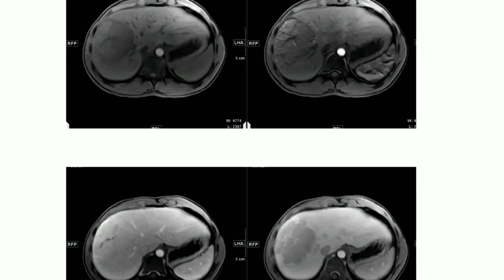Okay. So, ma'am, only a scar is not a specific sign. We have to look for the other features. Okay, ma'am. Thank you. And if someone argues with you, is it FNH? Is it fibrolamellar? We mentioned just now a confirmatory type of contrast.